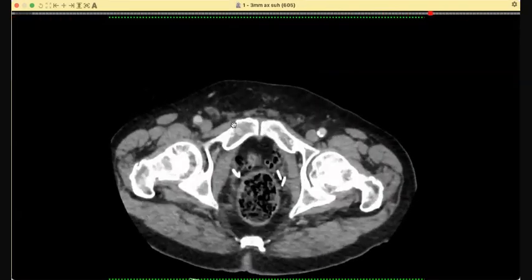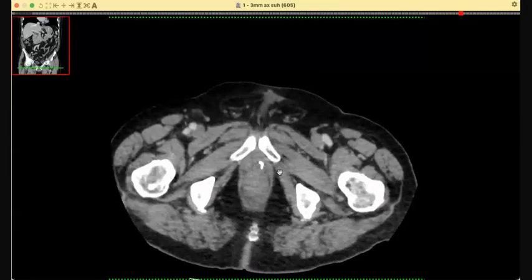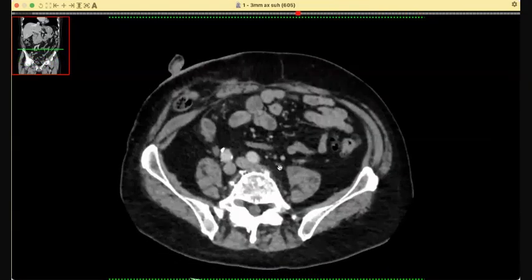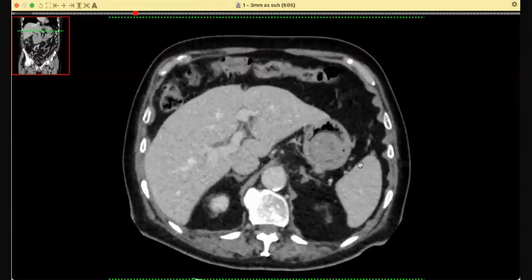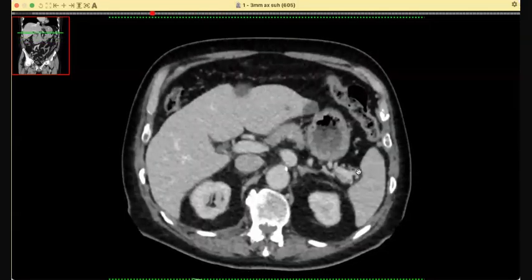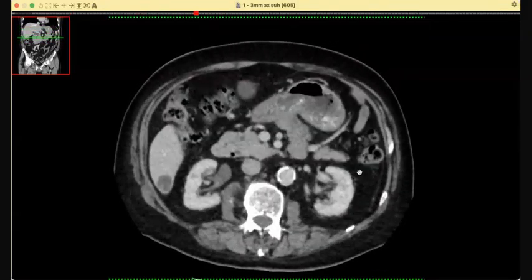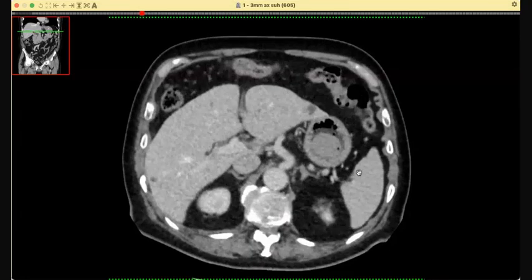The candidate did well where the observation was that the bladder is absent, and it was absent, as I've told you. So this case was a satisfaction of search case. First of all, your knowledge of what has happened. It can be a long case. You have to tell in your report that this is status post ureteric diversion, ileal conduit, etc.